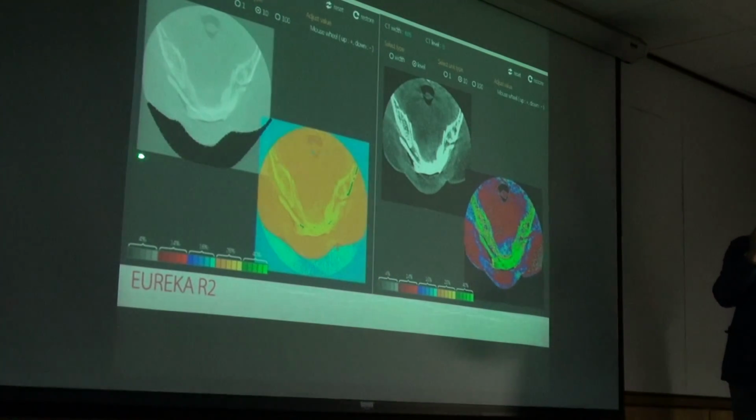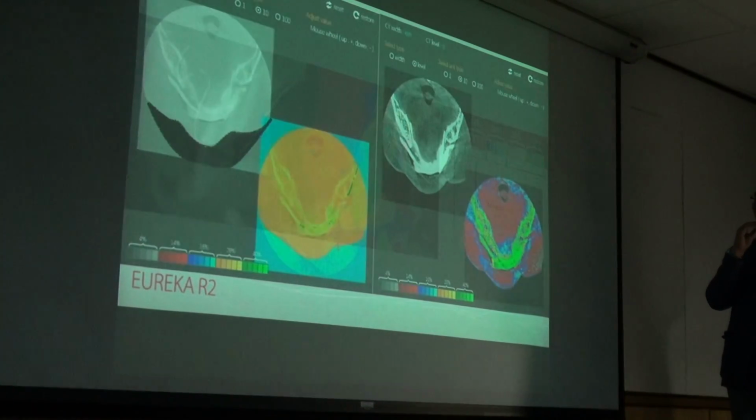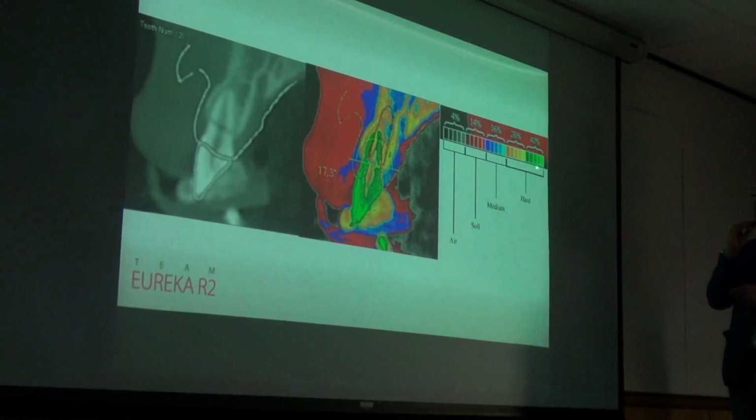So I change this air to a dark color, and based upon this logic, this ugly CT view changes into the full color range like this. It's very simple engineering. And with these kinds of spectrums, we can easily detect the bone hardness.